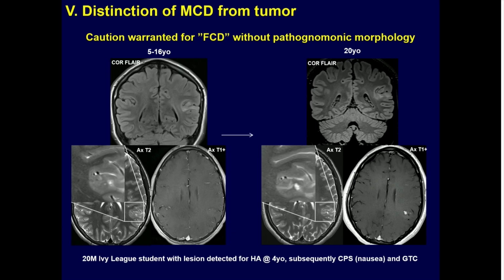This patient is a good student, had seizures that were well controlled. He was getting intermittently imaged for a period of 10 years, went to college, had a breakthrough seizure, and got re-imaged for the first time in a few years. And you can see that this area of FLAIR hyperintensity, there's a little focal T2 hyperintensity, and at this point it becomes a more defined thing and it's enhancing, so it's presumably a low-grade tumor.